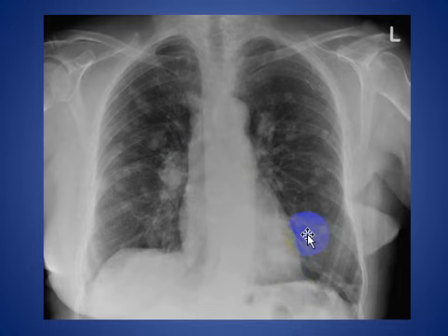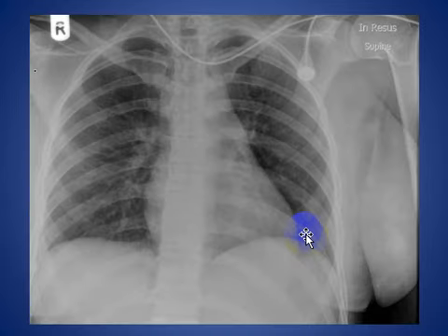So this is a left mastectomy in this patient with multiple nodular shadows representing metastasis. So this is a classic case of metastasis from left breast cancer following mastectomy. Here, another case. Look at it and try to find what is the pathology.